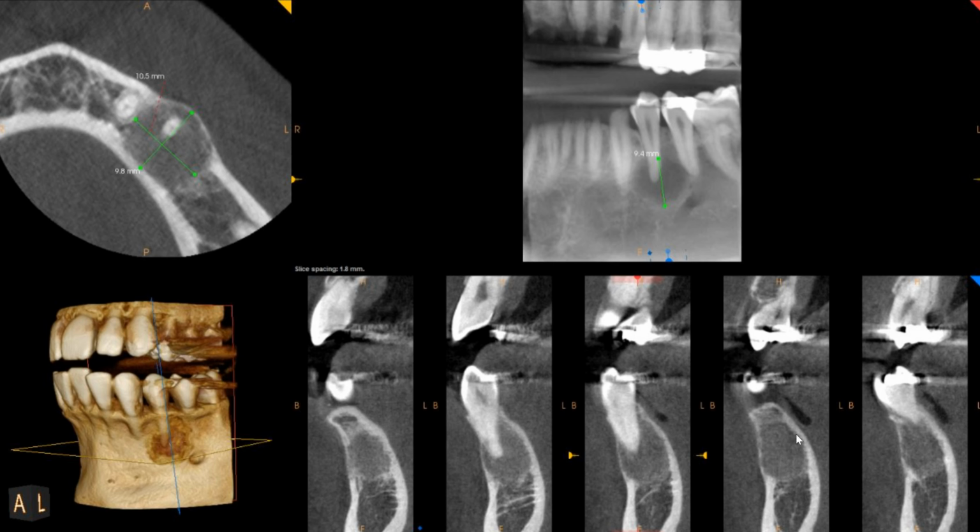So I can follow the border, but I don't see a highly corticated outline, especially along the inferior and superior aspect. And the lamina dura, I only have these two cross-sectional images to evaluate, but it's unclear. I don't see definitive outlines of the lamina dura.